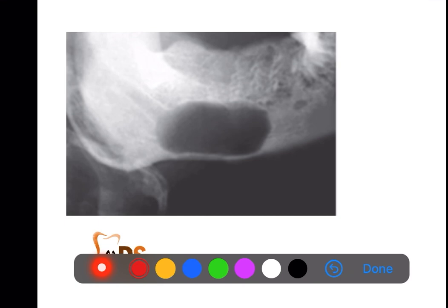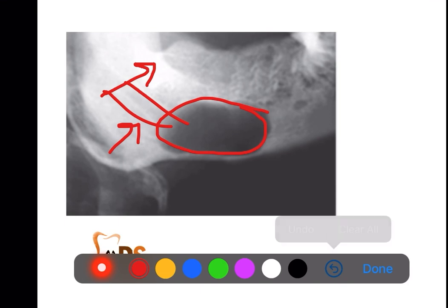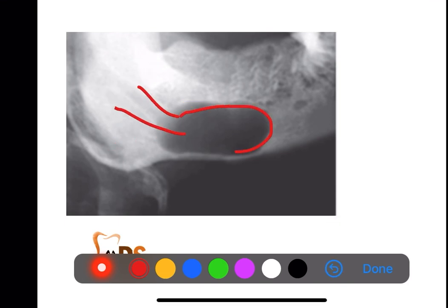So the question can be asked, if you see this particular picture, why is it neuronal or nervous in origin? Why is it within the canal? Because if it is odontogenic, the canal will be displaced downwards, right? If it is something like a developmental salivary gland defect, as we have seen in the other picture, the canal will be displaced superiorly, right? Here the canal is in its place, and the radiolucency which you have seen here has originated from the canal, right?